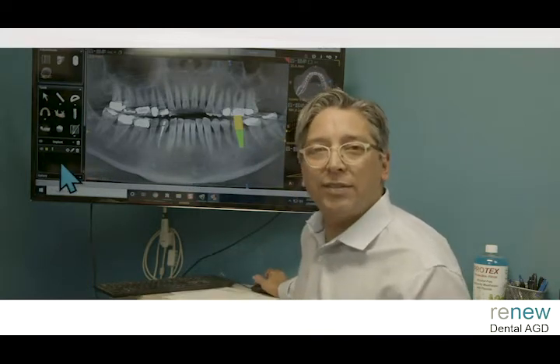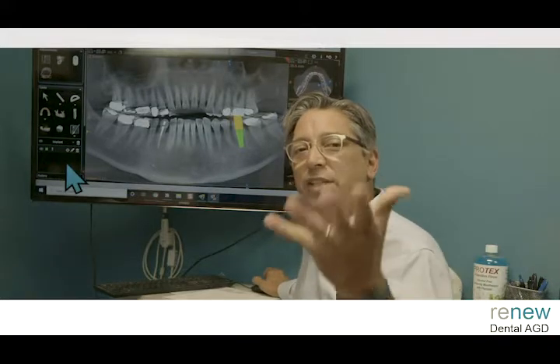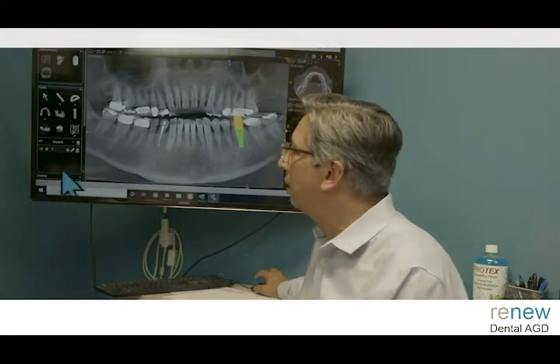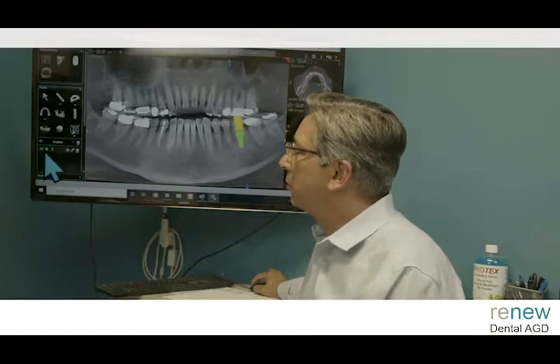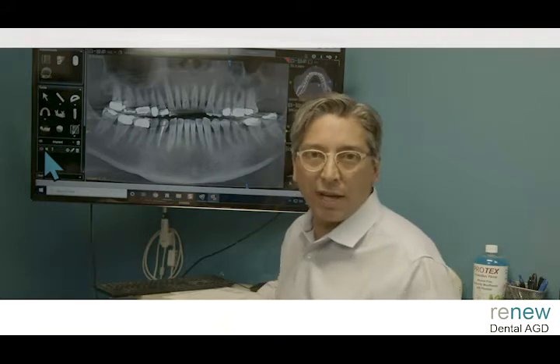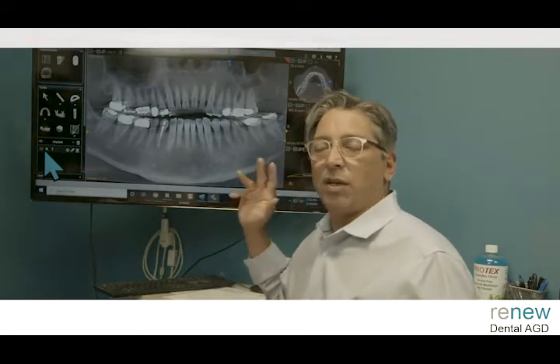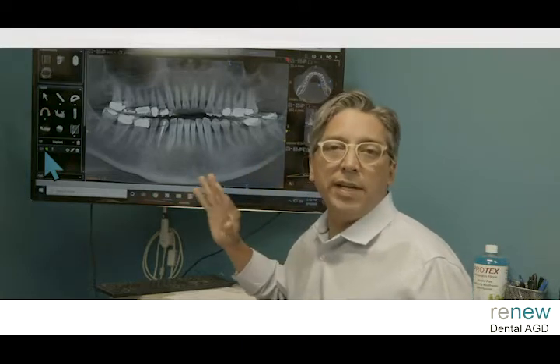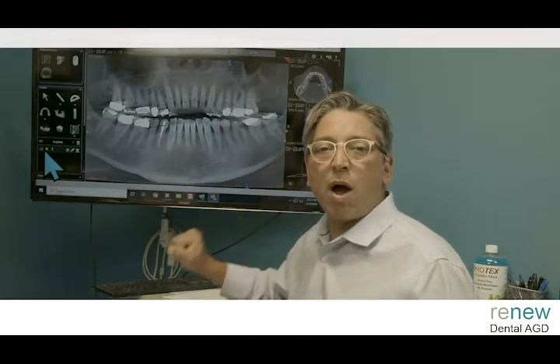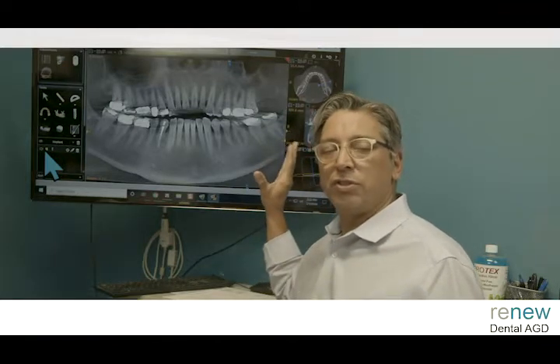This is a really simple case that I was just planning out here. It is very helpful for understanding how to use your CT scan, for the dentists out there. It might also be interesting to patients, on how dentists should be looking at things in terms of what's successful, what you need, what you don't need, and why you might need it. So how do you use your CT for just a straightforward case?